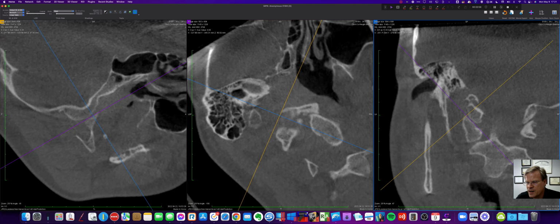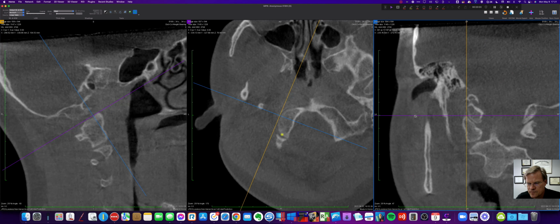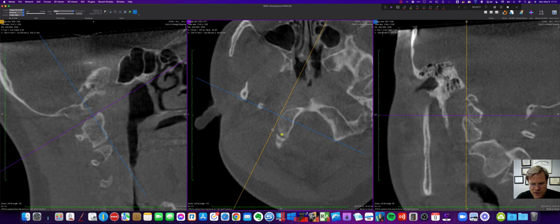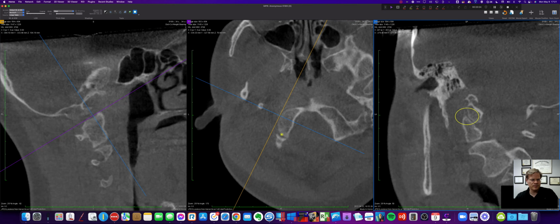Let's bring this back down to level. We're looking at, yeah, see, that's the very outside of the joint. Create a line just touching it. And we are getting an ASL. So I'm going to say overlap.